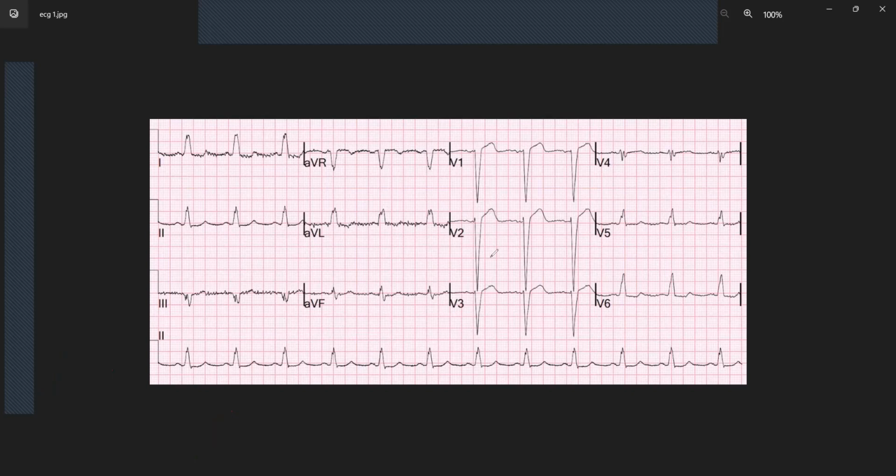Now, if they are concordant changes, you're only looking at very small deflections. So if you have a concordant change, let's say, for example, this QRS was going up like that, and on both of these, and you had maybe 2 blocks going up, that would really signify that you had an acute ischemic event going on. And once it's discordant, you're looking for more than 5 blocks, which we don't have here. We only got about 2 or 3.